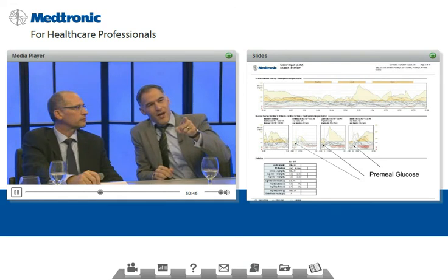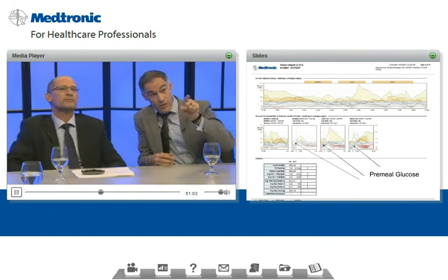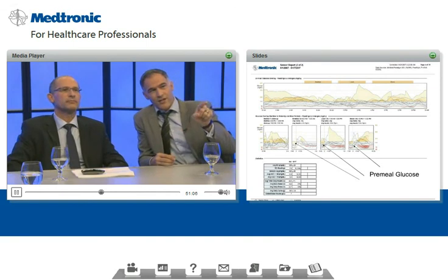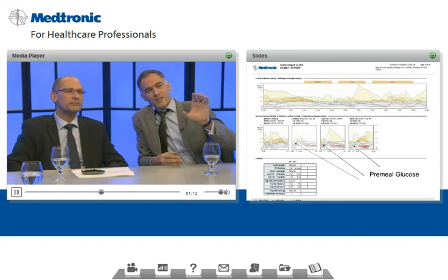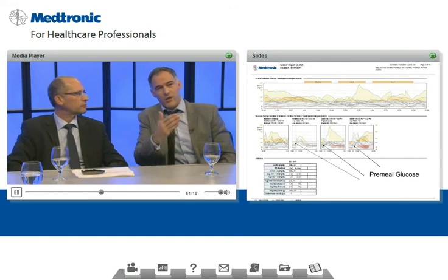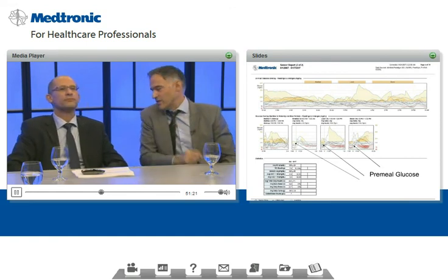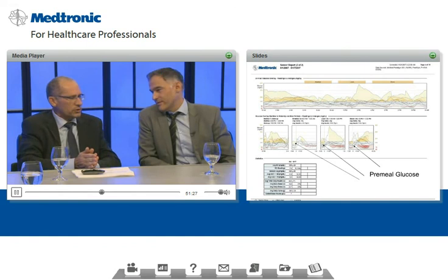So for example, on the upper overlay, you see the few red areas where there's hypoglycemia early in the night and fairly long duration. Are those occurring when there's bolus active? Because someone who's fearful of hypoglycemia will say, Dr. Cohen, those make me want to decrease my overnight basal, but in reality, I agree with you, there's a drift up in most of those lines. So then you could see in one instant that the hypos were following a bolus or when a bolus was active, and the other trends upwards were when only basal insulin's active. So you want to differentiate the effect of the basal versus the bolus, right? Which is a very good idea.